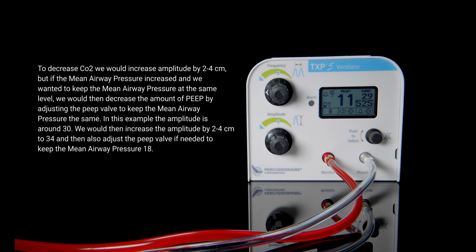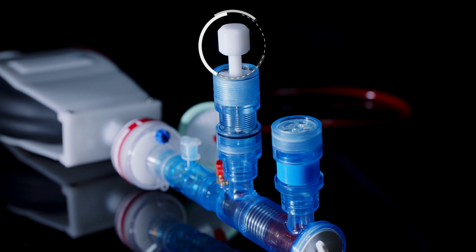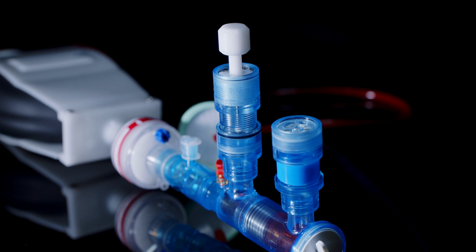But if the mean airway pressure increased and we wanted to keep the mean airway pressure at the same level, we would then decrease the amount of PEEP by adjusting the PEEP valve to keep the mean airway pressure the same. In this example, the amplitude is around 30. We would then increase the amplitude by 2 to 4 centimeters to 34, and then also adjust the PEEP valve if needed to keep the mean airway pressure 18.